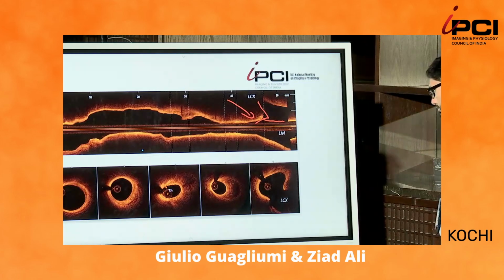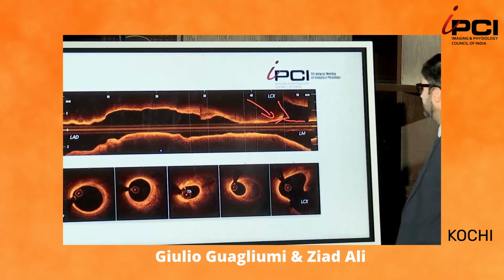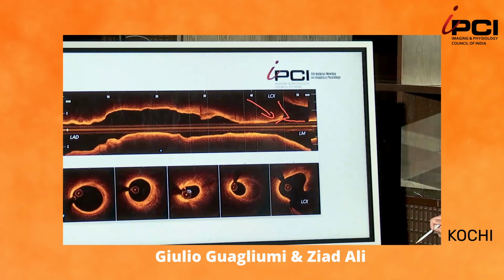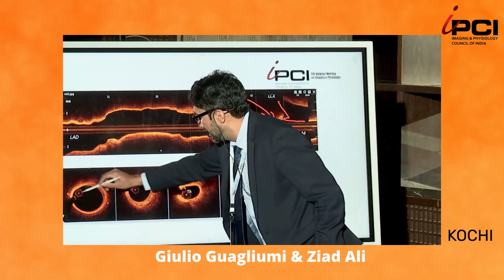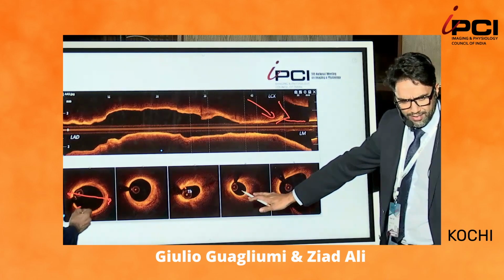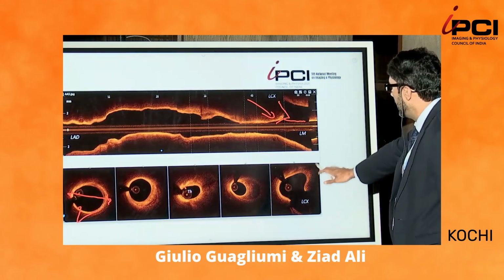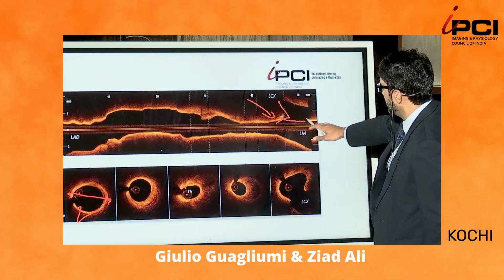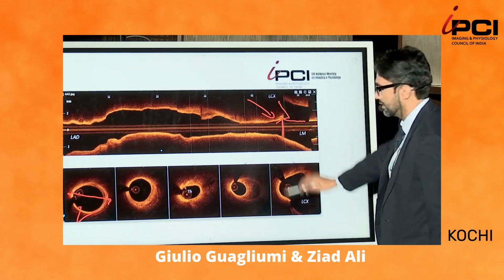So suppose that this is your patient. Based upon the type of plaque, based upon the position, here I'm going to be making an external elastic lamina to external elastic lamina measurement. This is all fibrous tissue. I'm going to direct stent this. It doesn't need any advanced lesion preparation. And in this situation, because my angle is short and my carina tip angle is also short, I would be planning to land my stent at the ostium.